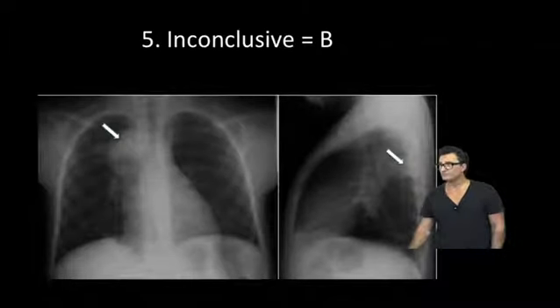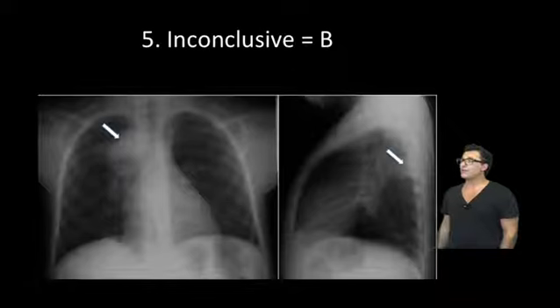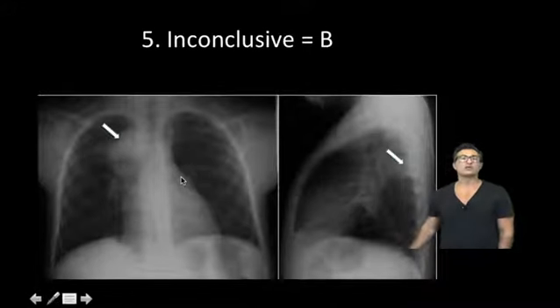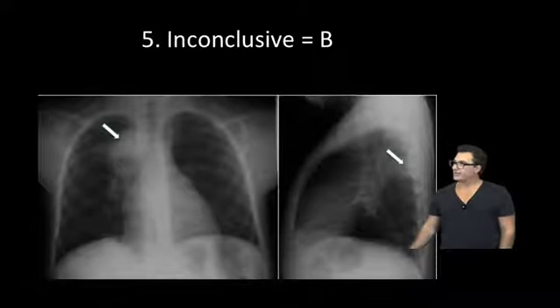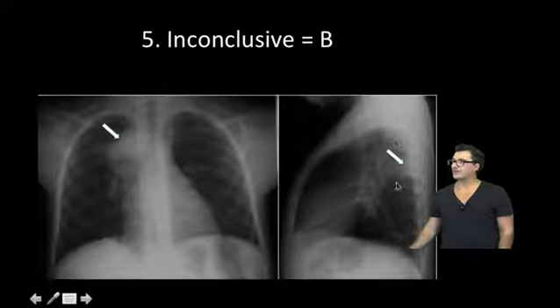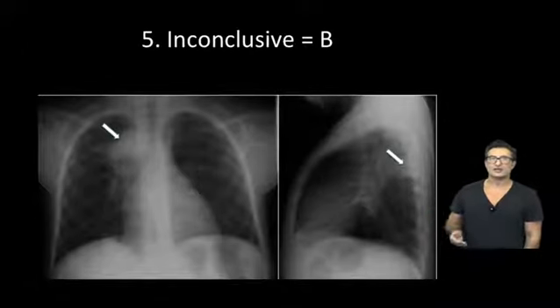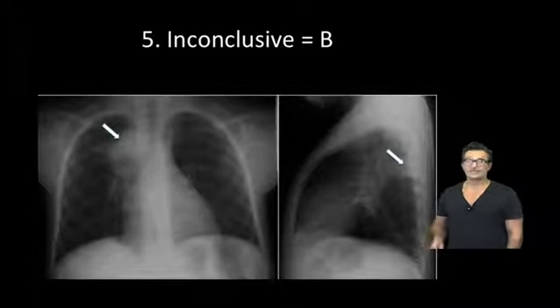That's a B. Here, this would look like an abnormal soft tissue mass, paratracheal. And at first glance, I also thought this is a really good example of paratracheal lymphadenopathy. But if one uses the lateral, and I haven't done much detail telling you to look at the posterior, anterior, middle mediastinal, but if you do look at the lateral, you will see that the soft tissue density is at the back. Now, this is a differential diagnosis, including neurogenic tumors, other developmental structures, and is probably not a lymph node site that's recognized for TB.